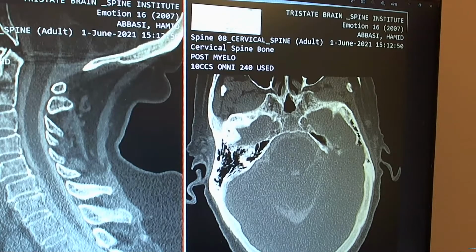Now, oh my God, that is horrible. The patient is missing the mastoid on the other side. What is that disease called, that you're missing one side's mastoid cells? Obviously, I'm joking, right? So why do we see the mastoid cells on one side and not on the other side? Who's going to be able to tell me?